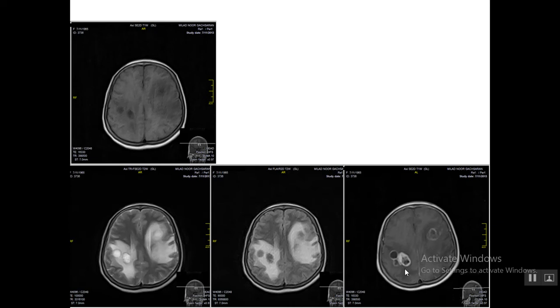to each other, or three nearby ring enhancing structures in the right posterior corona radiata, and another one is seen in the other hemisphere anterolaterally within the same level, and you notice disproportionate edema compared with the primary images.